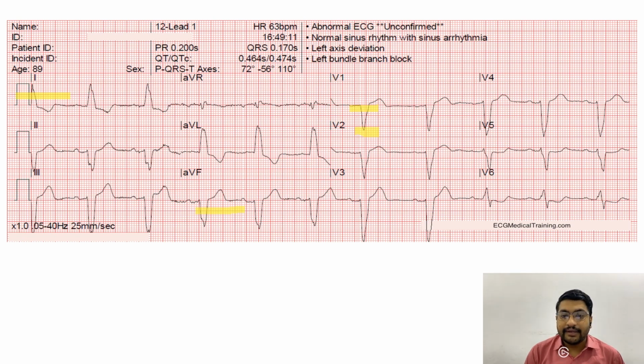And again, our ST segment is slightly elevated with positive T wave, but in V6 we cannot actually see the left bundle branch block trademark pattern, but ST segment is depressed and T wave is inverted as R wave is slightly slurred. If you see that here is a little slur, and similarly in 1 and AVL we see that R wave is slurred. So this is our left bundle branch block. I hope this cleared your concept.